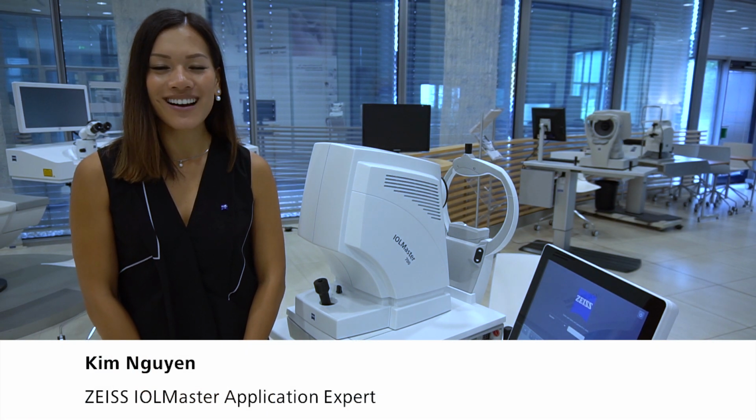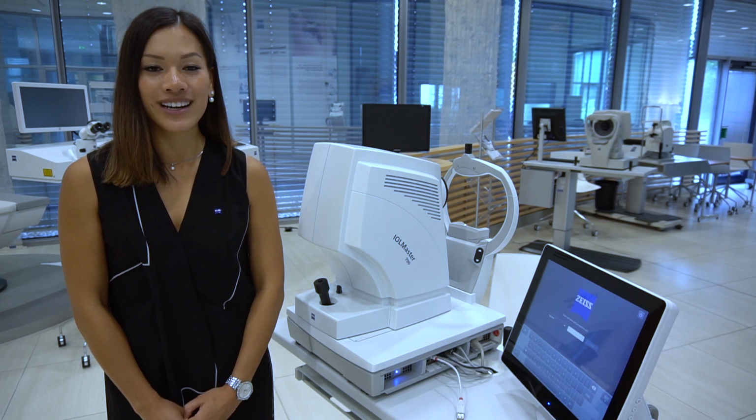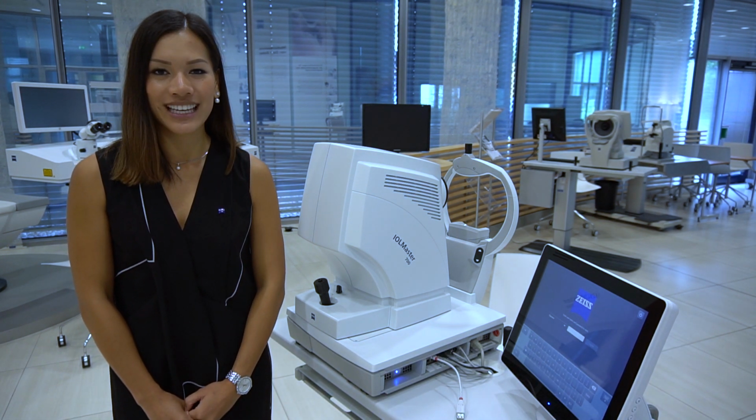Hello and welcome to the ZEISS IOLMaster 700 tutorial video. In this video, we will be covering non-toric IOL power calculation.